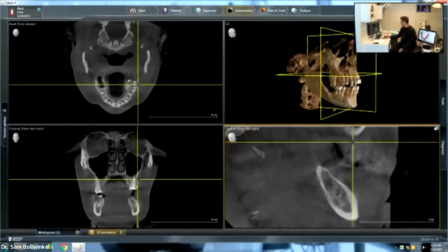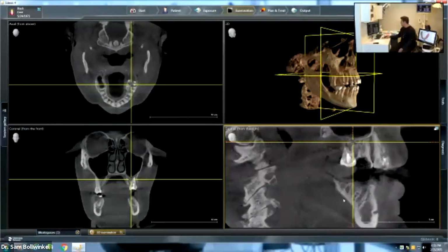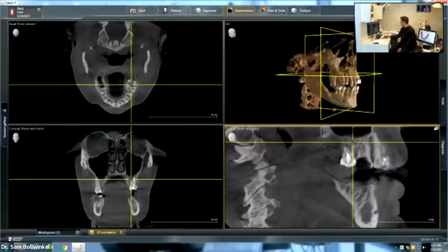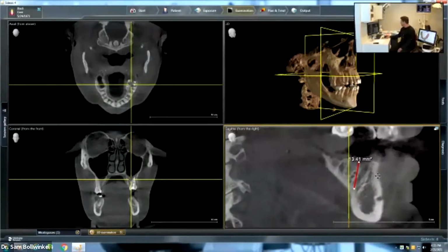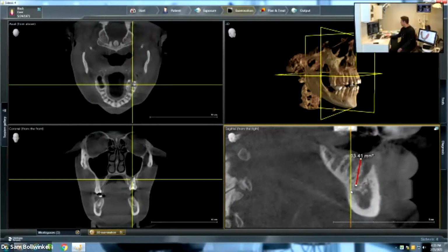But we're also looking at this patient. This is our patient today that we're working with and providing implants on this lower right side. So quite literally now I can come in, and if I'm evaluating this patient, the new patient coming into my practice, I'm going to want to look at this and go, well, what's the opportunity to do an implant? I can measure down the bone. I've got 13 millimeters to there, and I can pass through this and go, yeah, 13 millimeters. I've got plenty of room. There's my nerve canal here. As I pan back, I can see my nerve canal as it goes back. I'm down 13 millimeters from the crestal bone height.